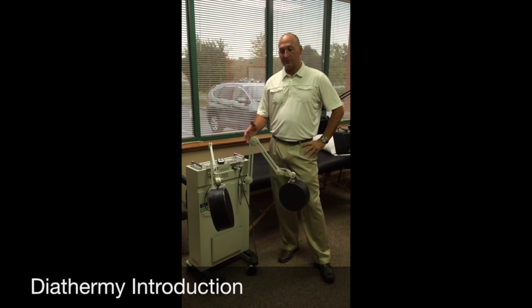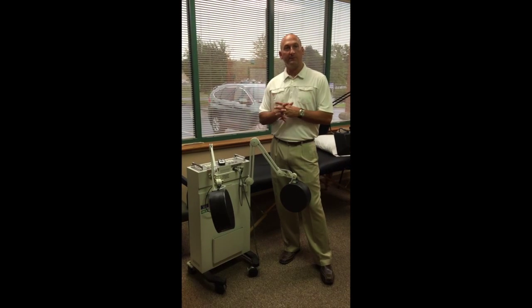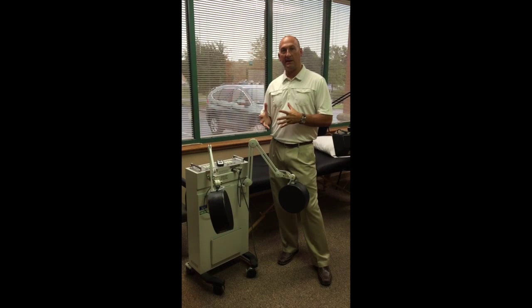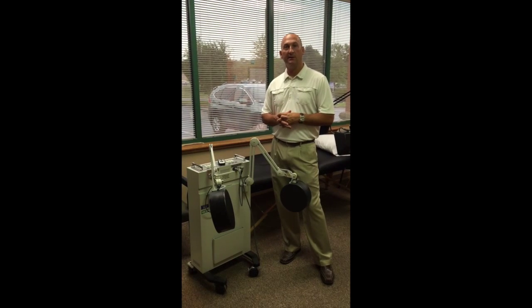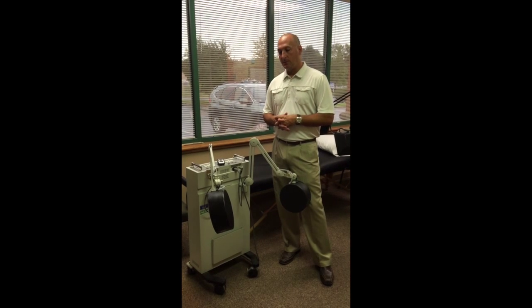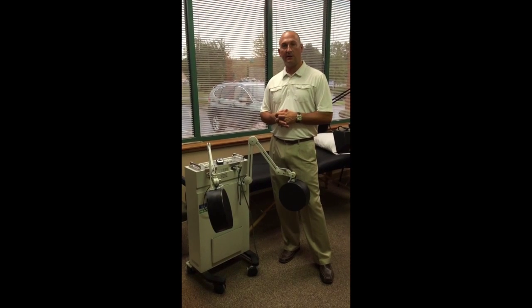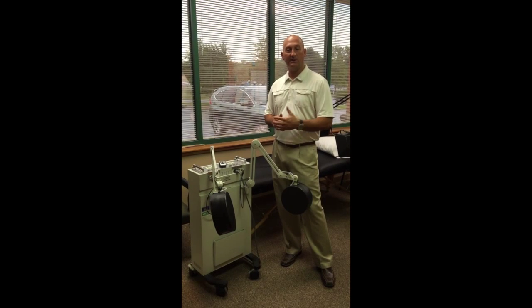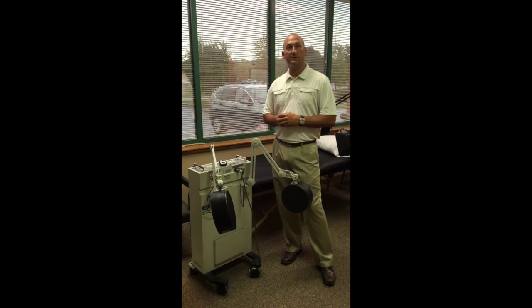We could treat a shoulder and a low back, or an upper back and a low back. These newer units also, the wavelengths and the forms are much more refined, so they may actually be a little bit more concentrated, the amount of energy that they feel, the amount of warmth. So you also have to take those into account when you're setting up these units.